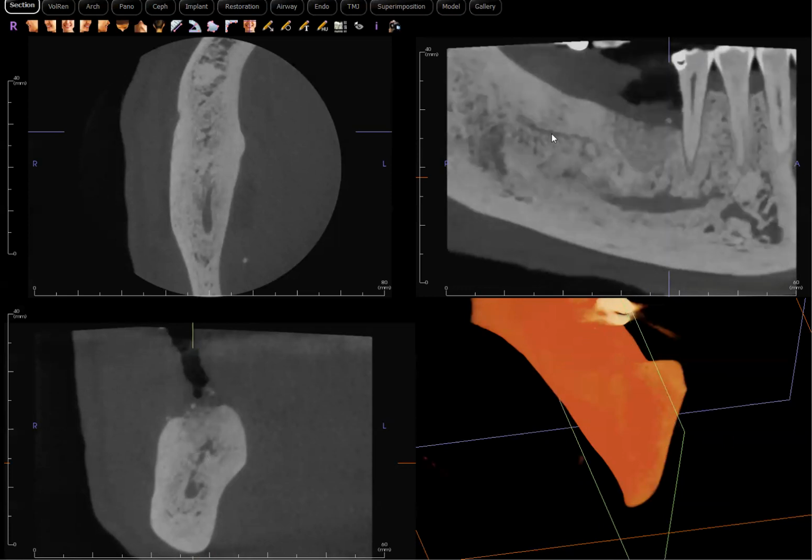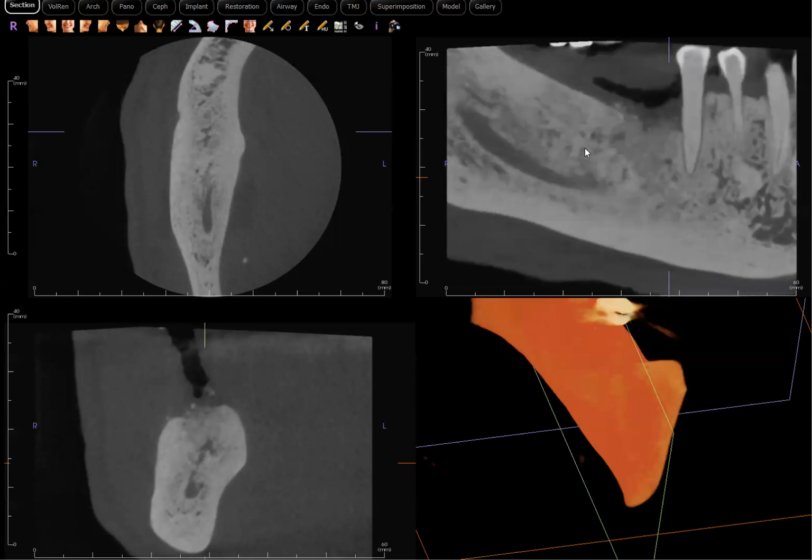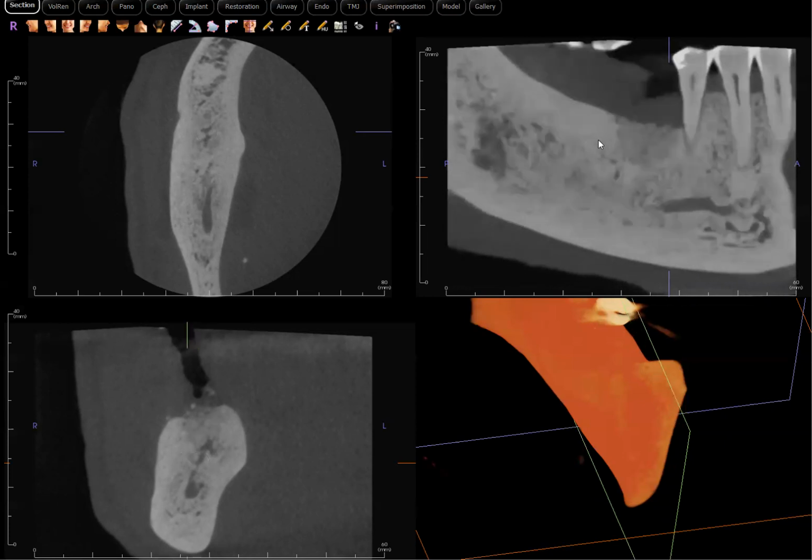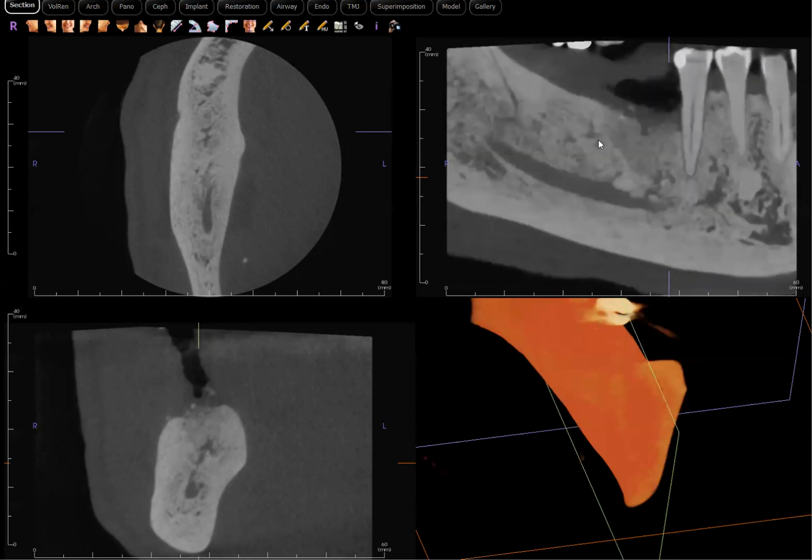We can never predict how much of these are present and the course of their pathway within the mandible. And I wonder whether extraction could damage some of these nerves, which then could manifest clinically. So that's kind of my unproven hypothesis, just having looked at a lot of CBCT images over the years.